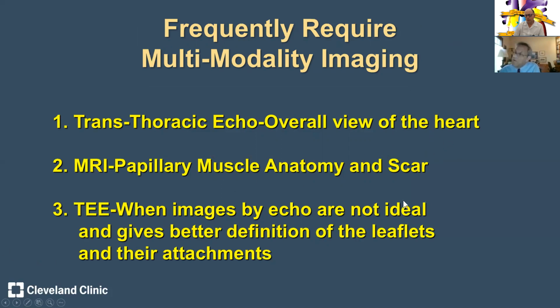Scar is important to look for because with increased scar, there's an increased incidence of arrhythmia. Transesophageal echo is helpful when the images by echo are not ideal, and it gives a better definition of the leaflets and their attachments.